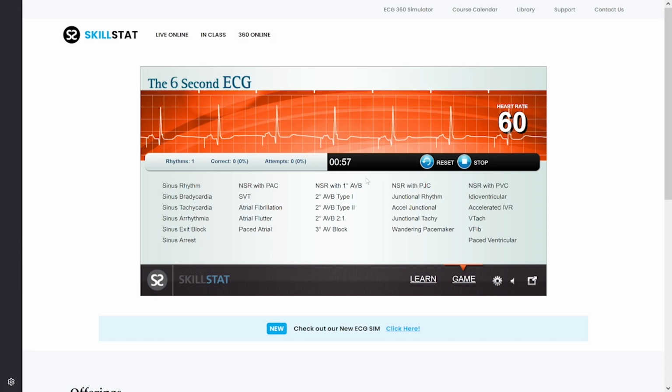Okay, now what do we think this rhythm is? Oh, shoot, this will take me a second. So just think about it while I panic and try to think about it too.